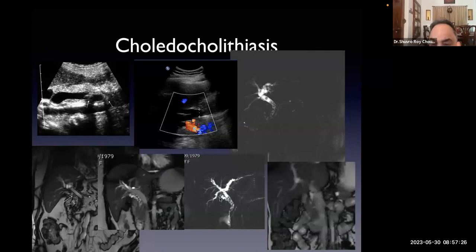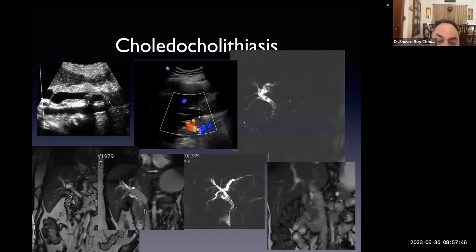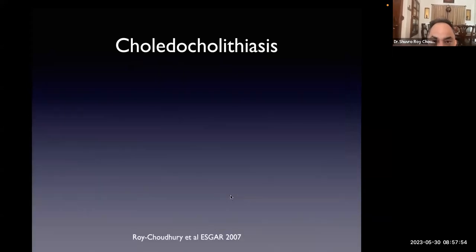So this was now with the bile duct, it showed up the image of the artery on the right side, on the left of bile duct. The artery can be seen on the FISP images. It is not going to be seen on the HASTE images. So this is a HASTE image. This is a HASTE image. In a HASTE image, it is difficult to see the artery. The FISP, which is the anatomical set of imaging, you can see the bile duct very well.